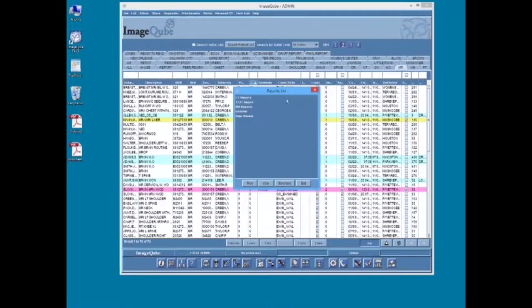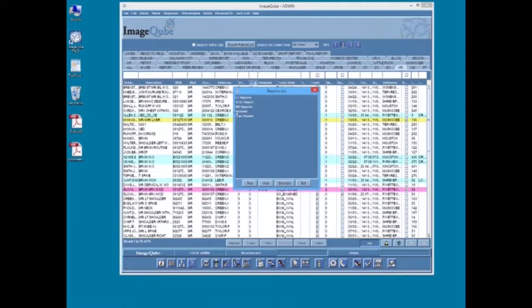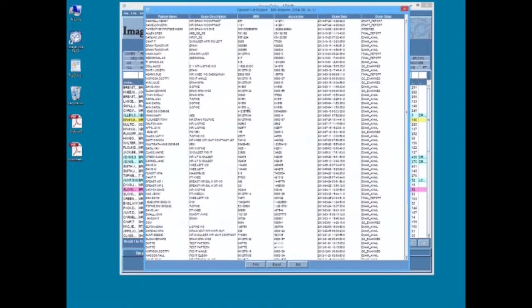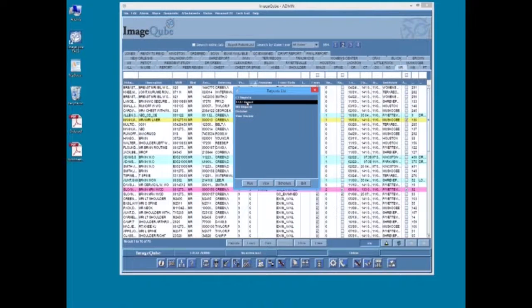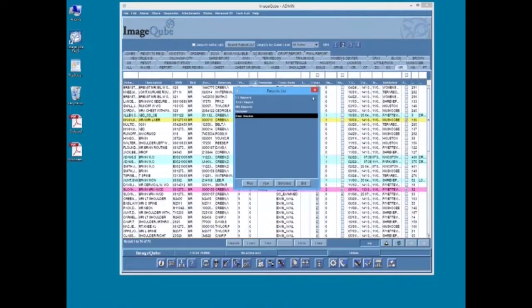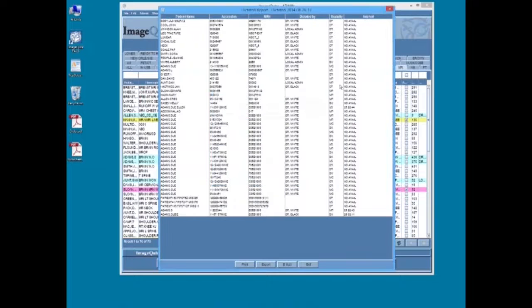In this example of system reports, which is accessible either from a drop-down or the action toolbar, users may view system reports based on dictated cases, timestamp cases were sitting before being read, peer reviews, the number of studies that have been read by specific users, etc. These reports, again, are saved and are accessible at any time, may be set to be scheduled for any date and time period, exported to the local workstation, or emailed.